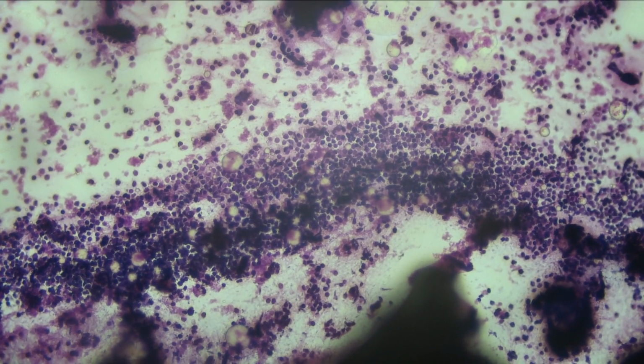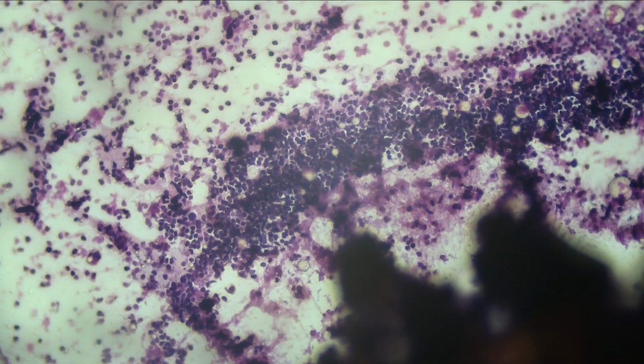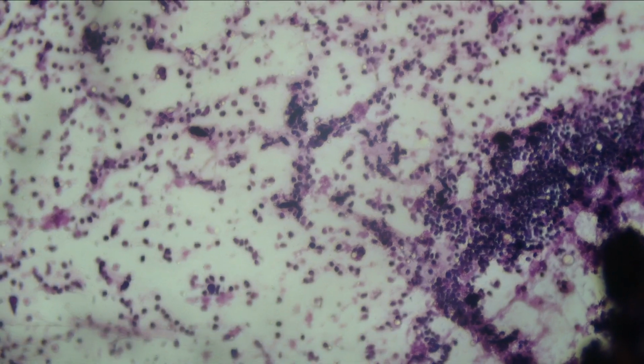Dr. Hassan, what do you think about these cells here? Yeah, these are inflammatory or no, small blue? They look more like not these ones. Can we go back to the other one with that bunch of those?